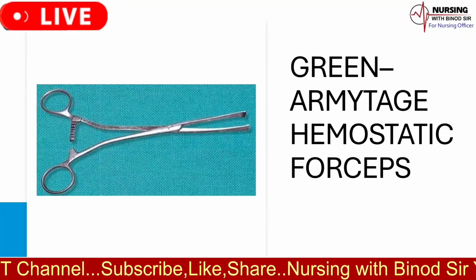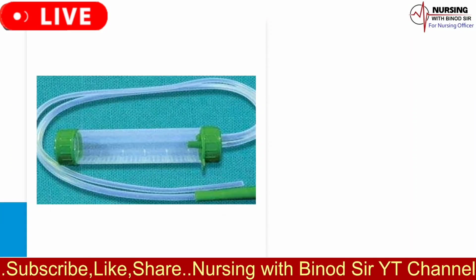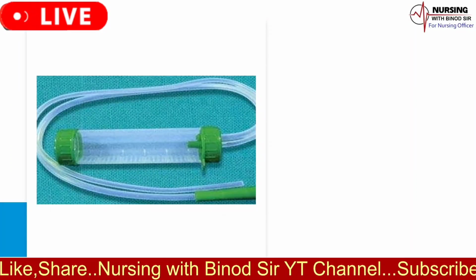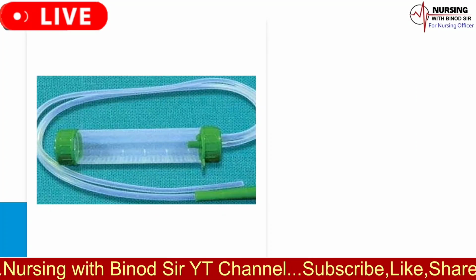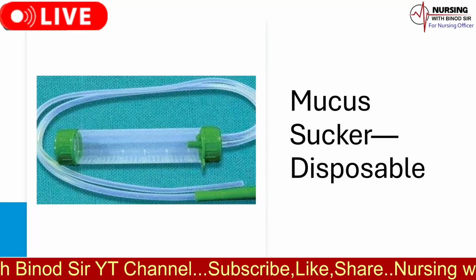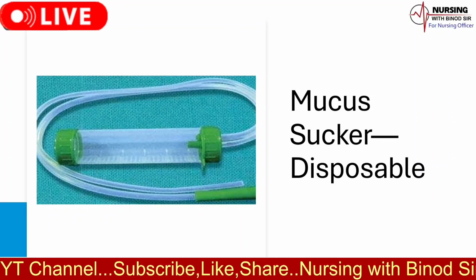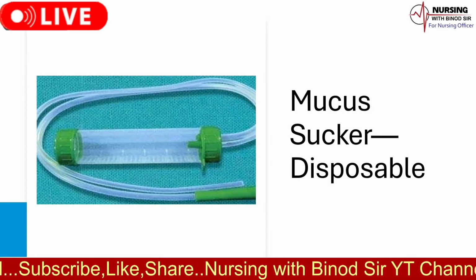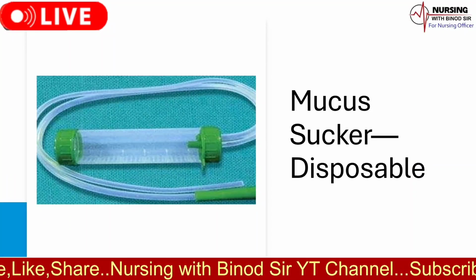The name of the instrument is mucus sucker. The uses of mucus sucker is as follows. 1. Clearing nasal congestion. Mucus suckers help remove excess mucus from the nasal passages, especially in infants who can't blow their noses, improving their breathing. 2. Symptom relief from colds. Used to alleviate symptoms of colds by removing mucus buildup, reducing discomfort, and making breathing easier.